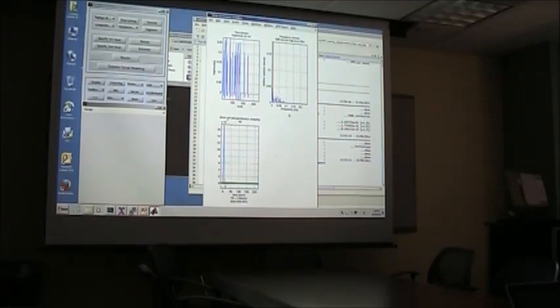This is not super clear in the sense that you can say whether this was too strict or okay. But if you saw this line all the way here, and all your signal was at a lower frequency than your cutoff, that would be a really bad thing. Again, hopefully this is something you won't have to worry about.